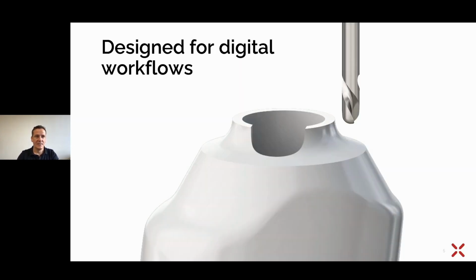When you see the prosthetic in this picture, designed for the digital workflow, you can see this is a typical round drill which every milling machine has. This round drill can be used for milling the connection absolutely perfectly. So you can see it is easily possible to mill this connection in a perfect fit. And the rotational lock can also be done really accurately by a good class milling machine.